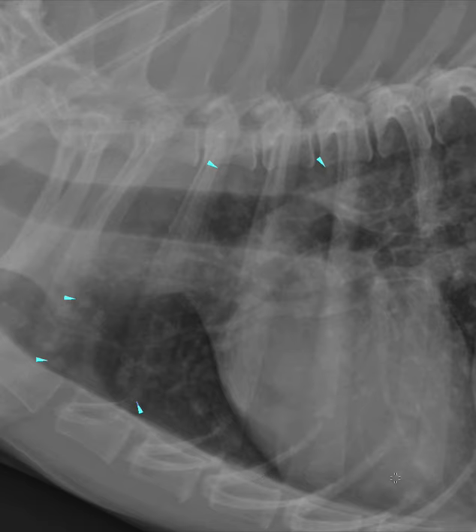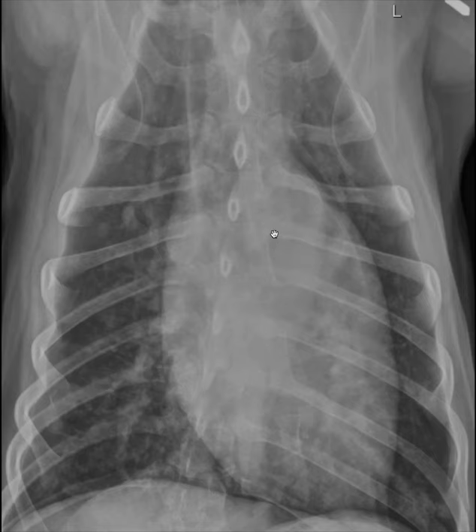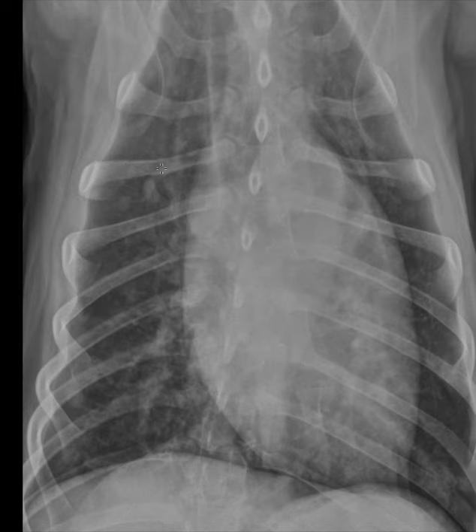So in this case, of course, we said, well, we're screening for metastasis. So one of the first things that it makes sense that we would all think about is metastasis. I'm going to jump to the other view just to show you in this particular case, this is an example of pulmonary nodules that are seen on all views in all lung fields.